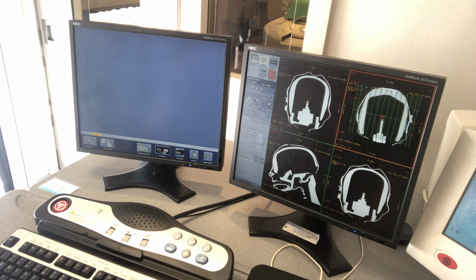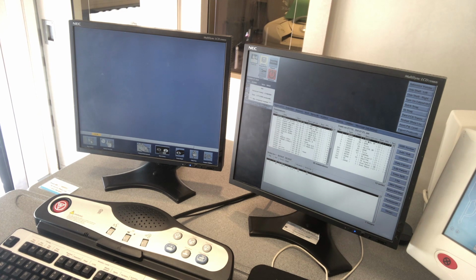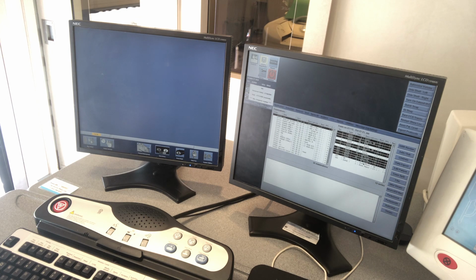So now let's exit out and make sure it saved those. So now they're here. So now we want to send things to PACS. Like I said, you don't send the thin, so you control and click what you want to send. Even these 3D saved images, I don't know what they are, but send them anyway.